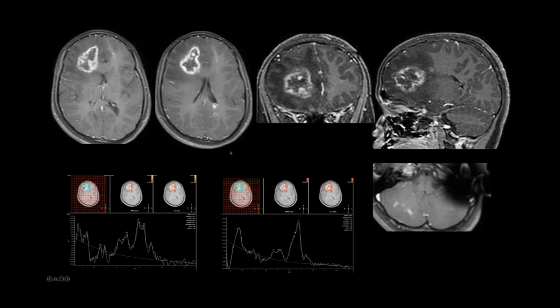Going back to the MR, on the post-contrast images you have ill-defined areas of ring-like enhancement in the right frontal region. The left posterior lesions also demonstrate ring-like enhancement. There are some internal projections in the right frontal lobe lesion, and the right cerebellum demonstrates some nodular foci of enhancement. Spectroscopy was done in the right frontal region and demonstrated a large lipid lactate peak. The rest of the peaks I cannot find to be of diagnostic significance.